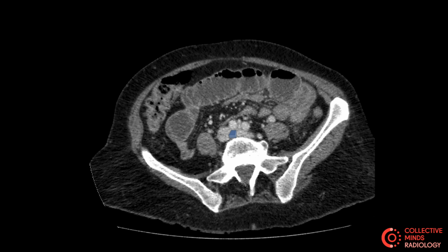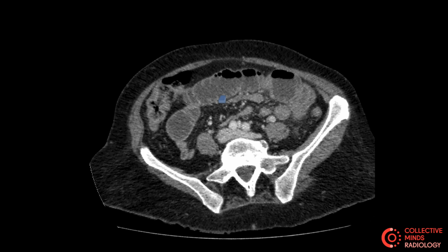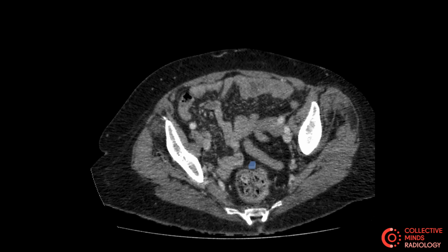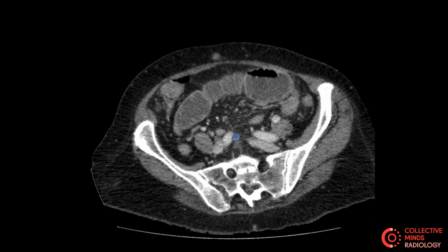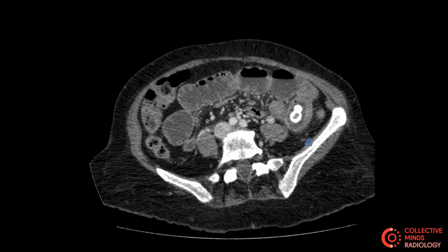Clearly small bowel is far too large. Small bowel should not look like that. It should be very, very collapsed. So the small bowel doesn't look normal whatsoever, and you can see more small bowel located within the lower abdomen. So again, we've kind of gone through one thing to the next thing. We've noticed that the small bowel doesn't look quite right. What could have happened?